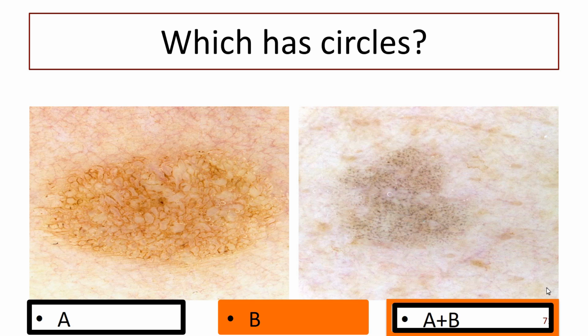We've recently done a research project where three dermatologists tried to decide what colours things were, and we found grey very difficult to agree on. But we would all agree on this being grey because we recognise the pattern, and that's a grey pattern. So when you see lots of dots like that, just remember they're grey, even if you see brown or black.